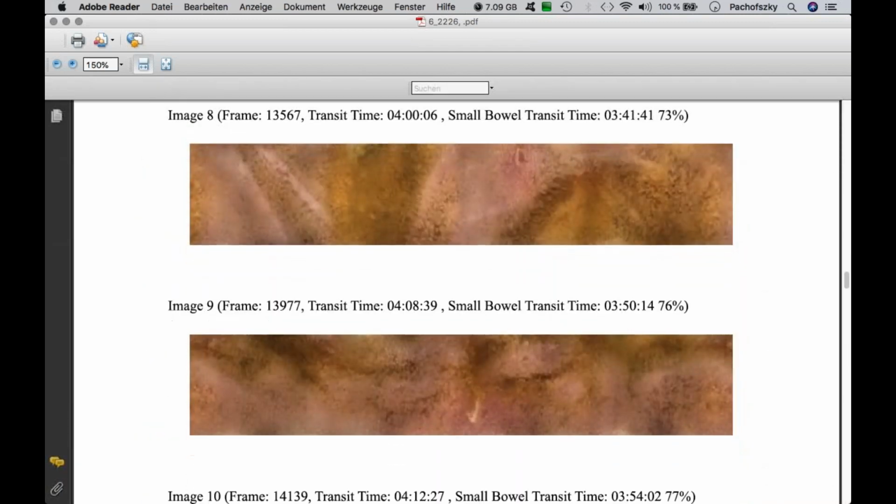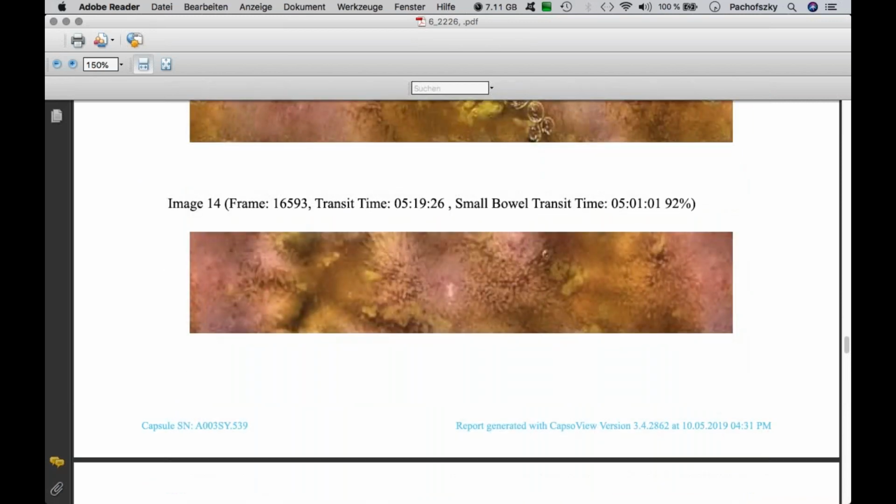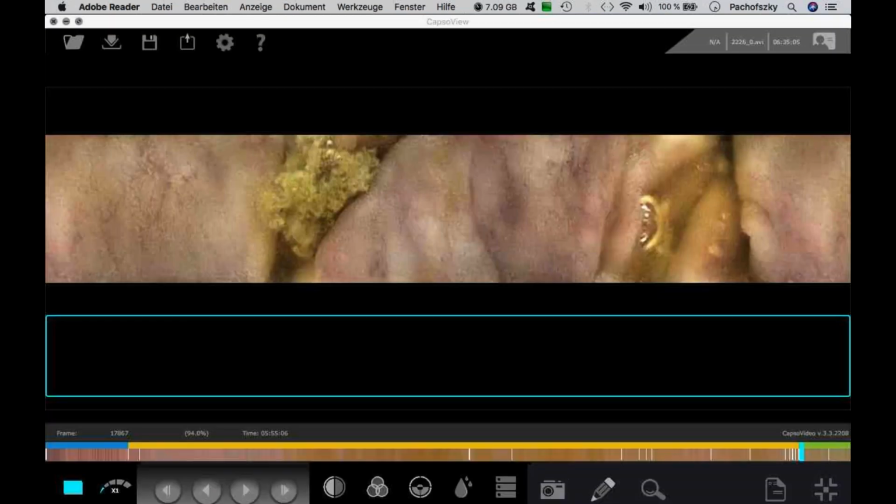So we have here now a really big number of pages, a lot of paper if we print this. And then you can go to print, you can store it wherever you want, and you have a complete report of this to finalize the examination.